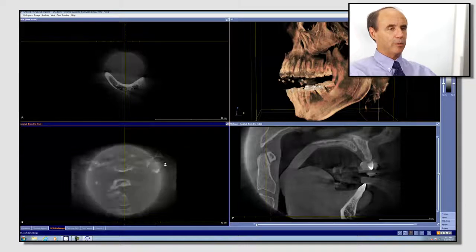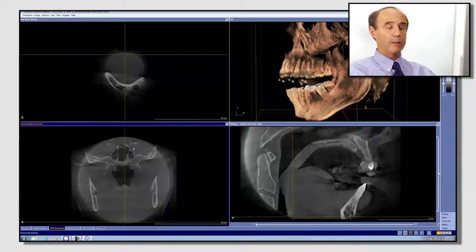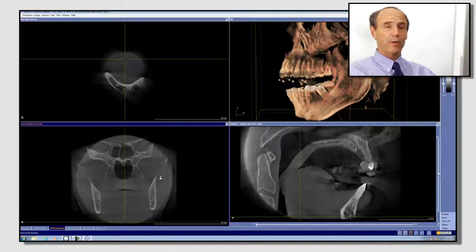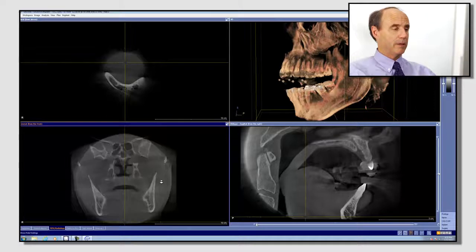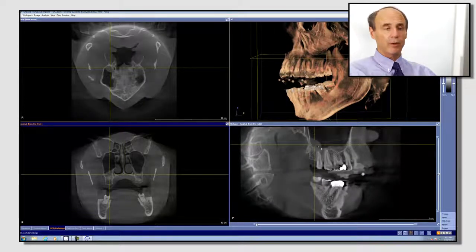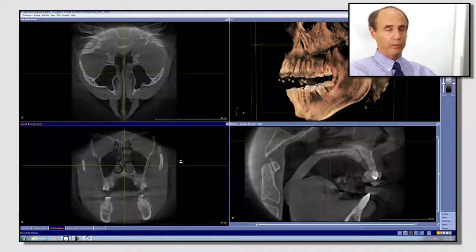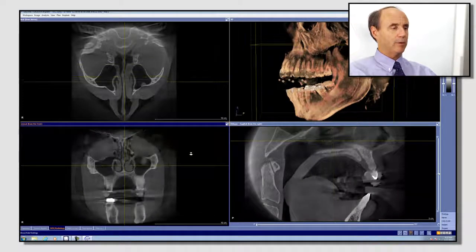So now we continue to proceed forward, again evaluating the temporomandibular joint, the airway spaces, both within the bone and in soft tissues. Nasal cavity, here we see another sinus thickening. I will double click, and I see it's just thickened mucosa in the sinus, which is no cause for concern. But I have evaluated this asymmetrical finding in all three dimensions, which is the proper way to view these. Again, I'll return back to the midline and continue moving forward until once again I've gone through the coronal anatomy twice.